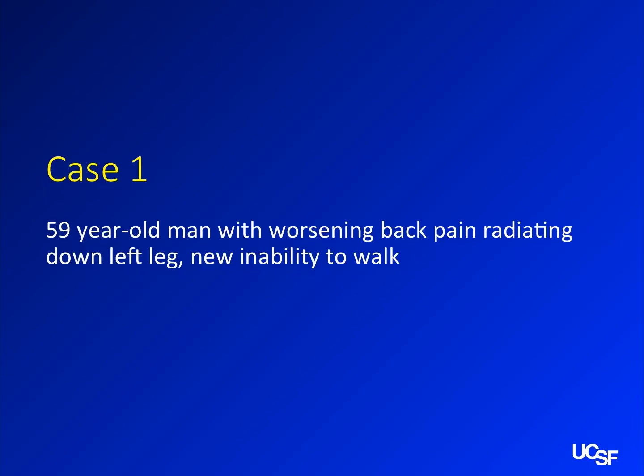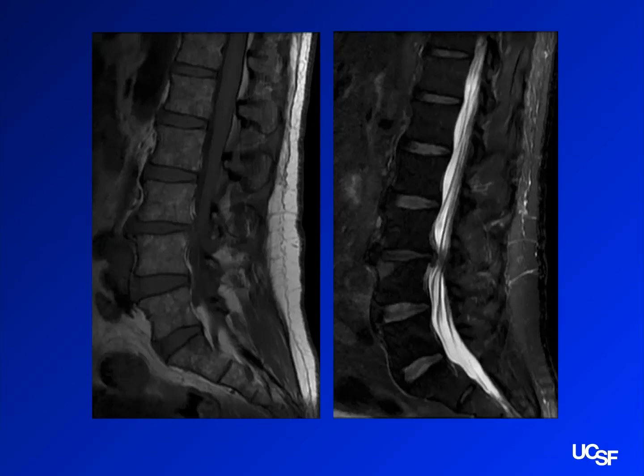This is a first year case. This is a first year who wants to take a case. All right, so this is a 59-year-old man. He's got radiating pain down his left leg. He can't walk. So tell me what you see on these images.